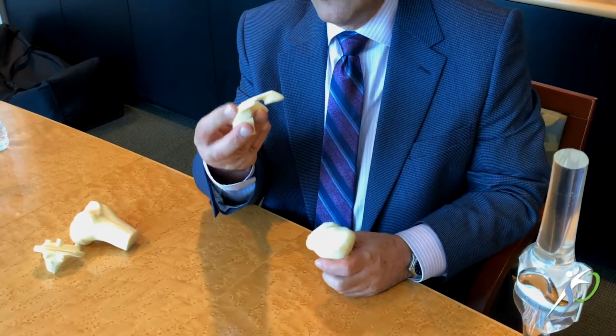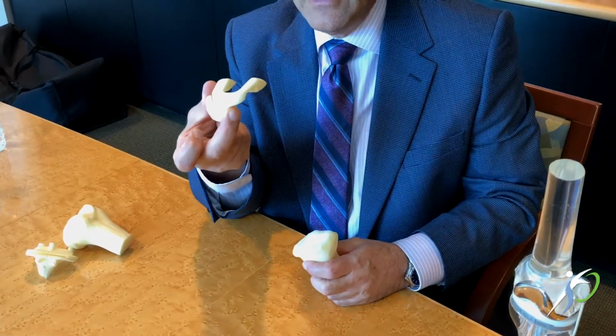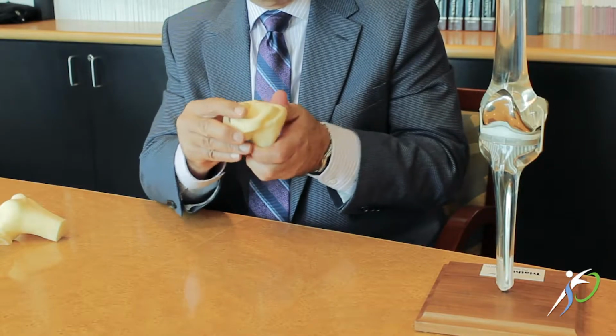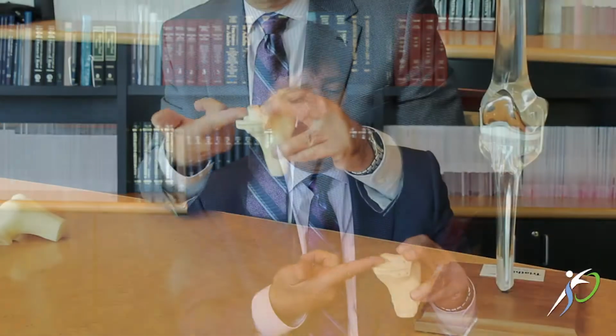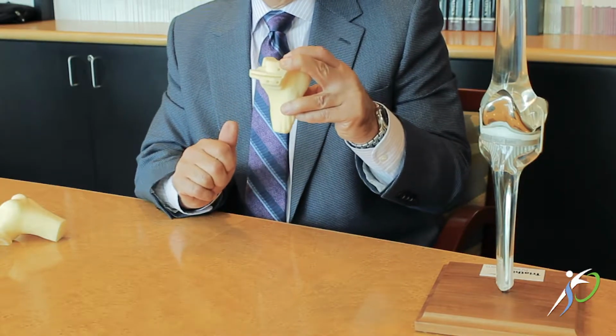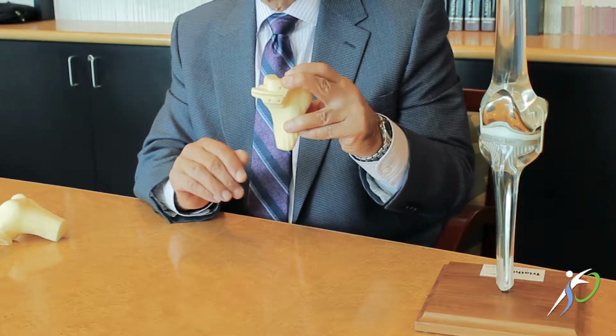This would show up in surgery, just this piece, and this piece would fit on the patient's bone again very precisely in a one-way method that locks in with pins through some holes in the cutting block. And you can see there's a slot here that allows the saw blade to go through that slot and cut the bone in a very precise way to make sure it's perfectly straight.